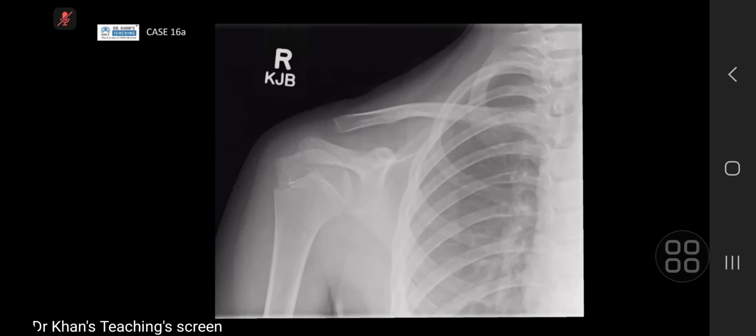Do you want to ask me? You can also see the right acromioclavicular joint, there is widening. Okay, so what if I tell you that you can feel a palpable lump or pain at the medial clavicle on the right? At the medial clavicle at the right.